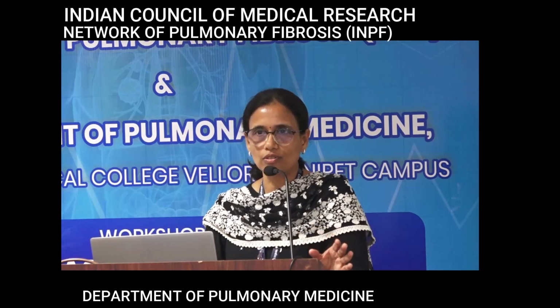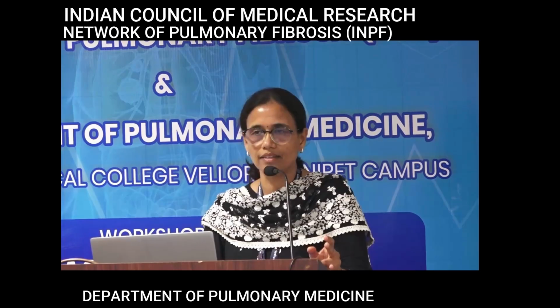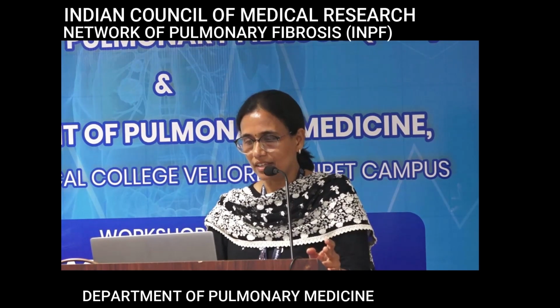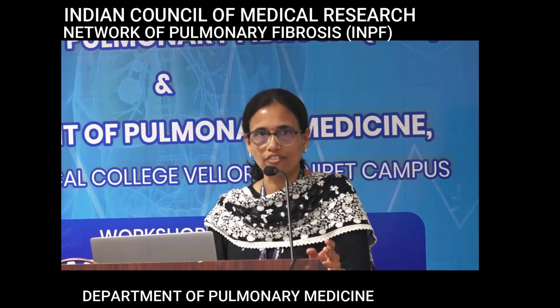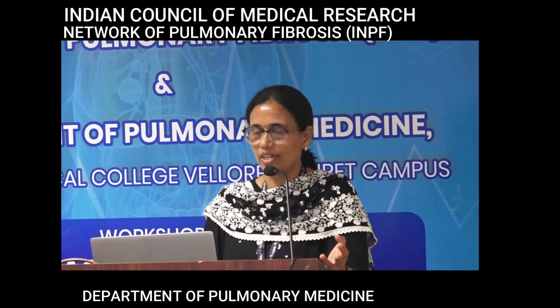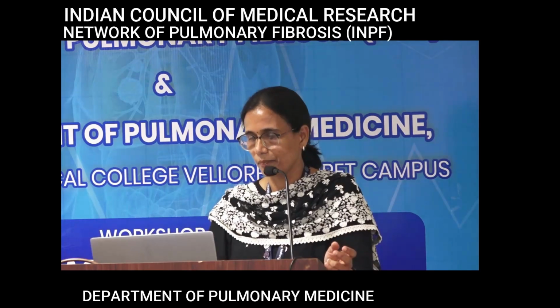If there are few nodules along the pleura and fissures, but it's not predominantly there, it's all over the place, then it is mainly a random distribution. Whereas if there are no nodules along the pleura and fissures, like we saw in our previous case, it is a centrilobular distribution, which we know can be seen in hypersensitivity, respiratory bronchiolitis, and also infections like TB.